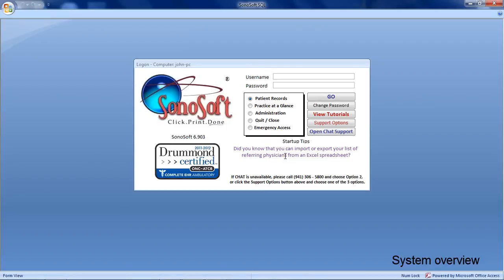Okay, welcome to Sonosoft. We're going to go through a brief system overview. Now, it'll be rather quick, so you can always pause, go back, or just watch the whole thing all over again. First thing is, we're going to sign in.